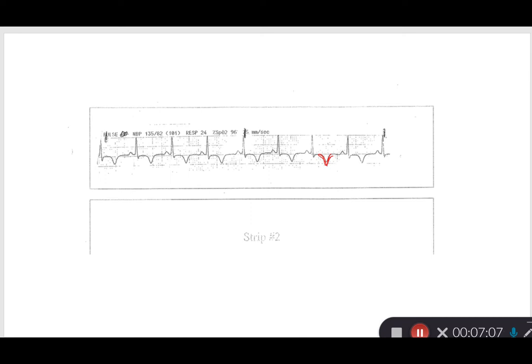Again, hard to see because it is scanned in. We have 5, 10, 15, about 19 blocks across. So I'm going to take 1500 divided by 19. That gives me a rate of 78.9, so we'll just call that 79 beats per minute. It's supposed to be a 7.